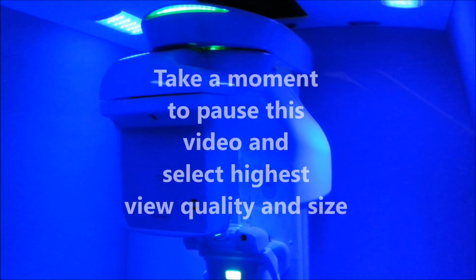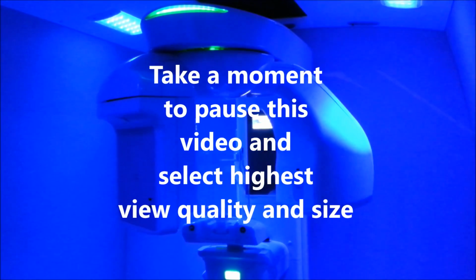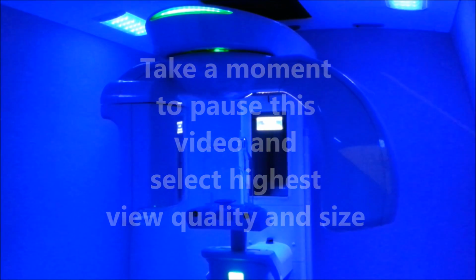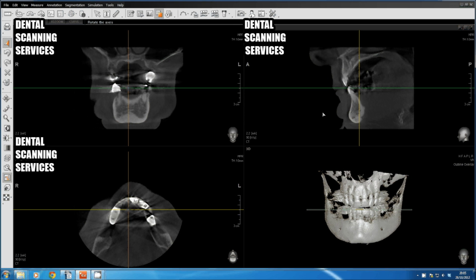Our clinic uses a high-tech digital X-ray system to provide the precise diagnostic image with minimal X-ray dose. When assessing the maxilla for suitability for implants, the first process is to create a panoramic view from the cone beam CT and the data provided.